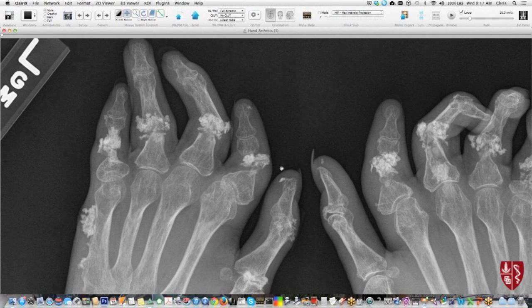It's good to think about psoriasis in that setting, because that can lead to really severe arthritis mutilans, and occasionally rheumatoid, but rheumatoid usually doesn't cause that extent of bone erosion. So this patient actually had scleroderma, but they also probably had psoriatic arthritis that was superimposed or concurrent, leading to that degree of arthropathy.